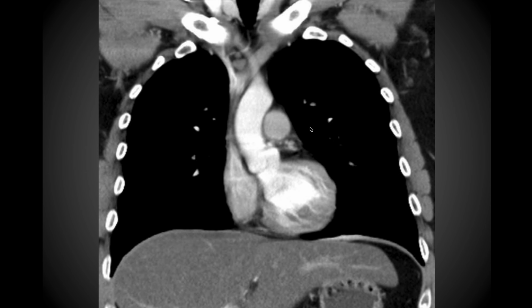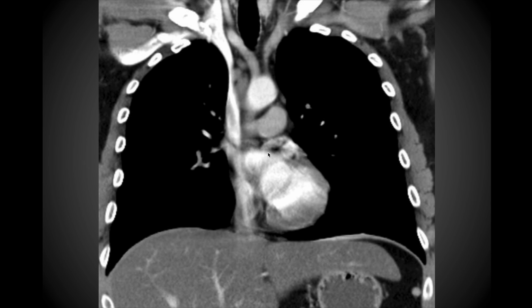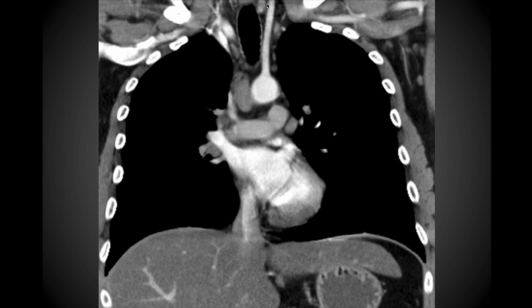But again, what we're going to do is look at this on CT to get a better view of it. So again, here you can see the heart. This is going to be coming off the left ventricle over here. So this is the ascending aorta. This is where the aortic valve is located right here, and so you can see the ascending aorta and arch of the aorta. And as we follow that around, again coming around the pulmonic trunk, here you can see the right atrium over here, and again the innominate artery, the left common carotid, which you can really well appreciate right here, the trachea, of course. And again, we're still just following this around here.